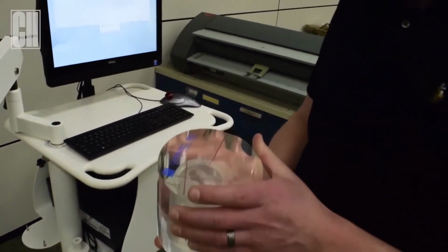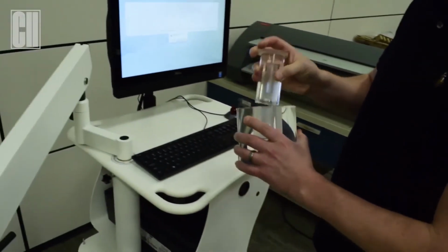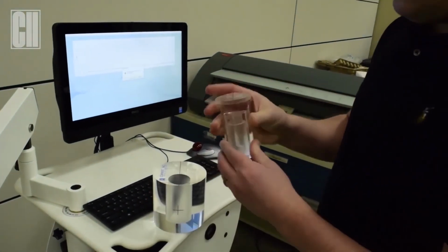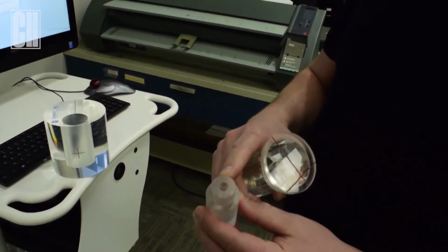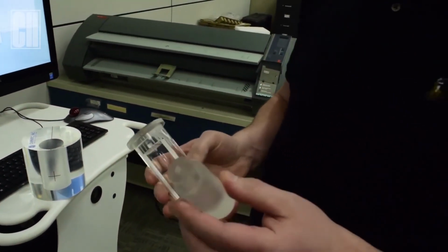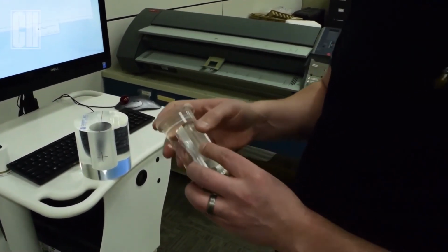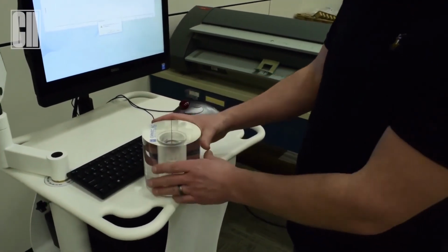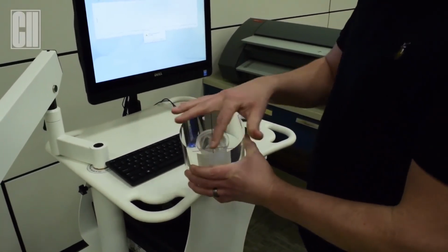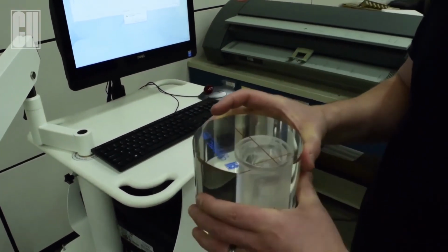Phantom. You will grab your Phantom, take out your holder, get the capsule and slide it into the capsule holder. Or if you prefer to keep the capsule in the container, you can place it into this centering, into the neck phantom. And you want to make sure that the lines are cross in both directions and line up, and position it where you want to measure your capsule.